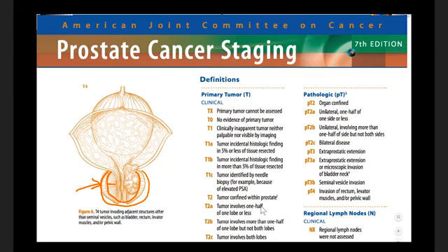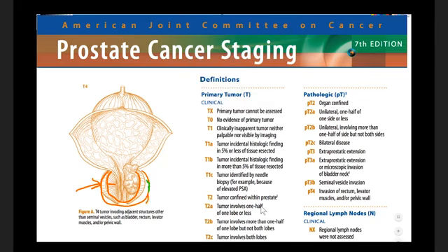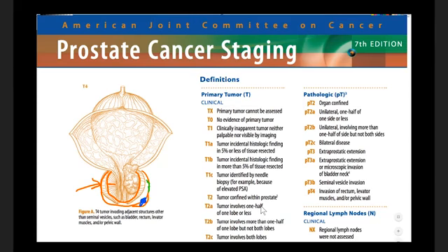So if this anatomic capsule is blurred or infiltrated, we lose that dark line, we have lost capsular confinement. Or if this capsule starts to bulge, if it's pushed out by an area of signal hypointensity on a T2 weighted image, that's another sign that we may not have capsular confinement. A third sign, if we have a broad area of capsular contact.